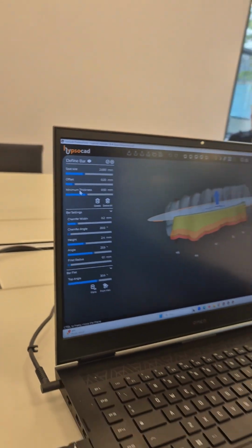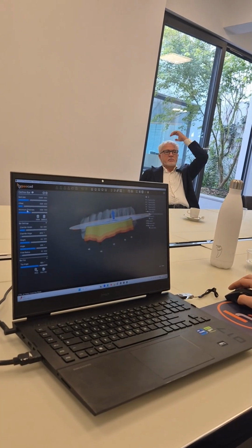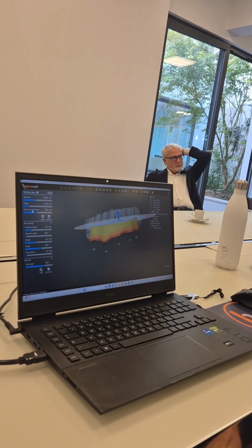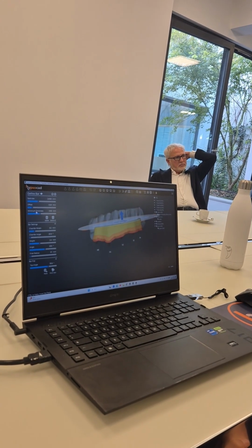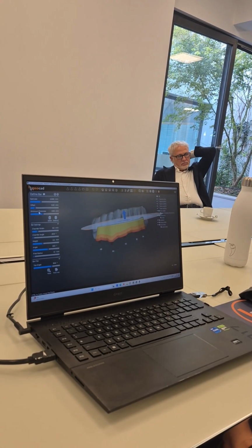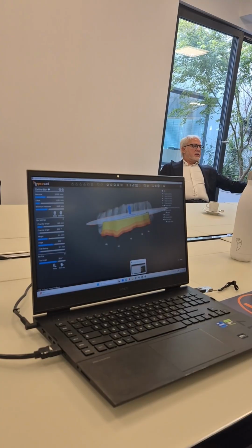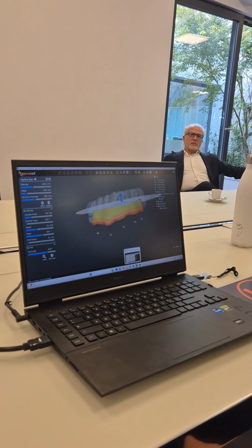Okay, but this offset means the bar with the upper part is from an ideal situation like 0 to 0, or maybe we can have a preset, because if the bar comes from laser melting and the upper part is milled, we have to do extra compensation, you know. Usually dental technicians like to do the bar scanning and after that the upper part, due to fitting problems. Do you have any special tricks to avoid that? It's automatic.